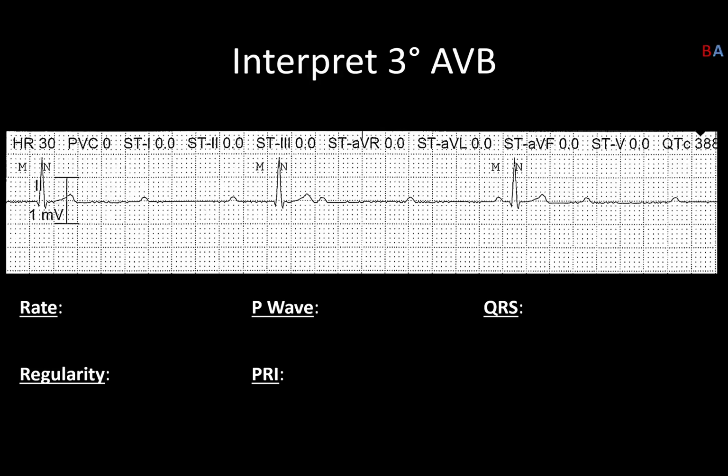All right, the math work on this is a little more intense, probably one of the more challenging ones that we've come across so far in the lectures. So please be patient. There's a lot of marking that needs to be done on the screen. This is really much easier done in real life when you've got a set of calipers, but hopefully this will show you what you need to do. It is a 6-second strip. I am going to go ahead and mark out the P waves that I know.